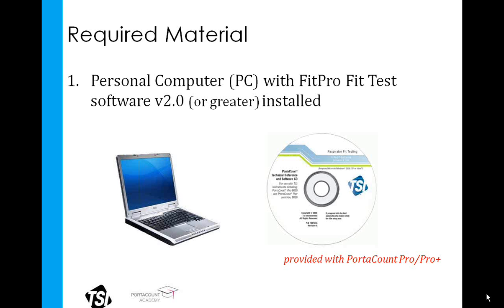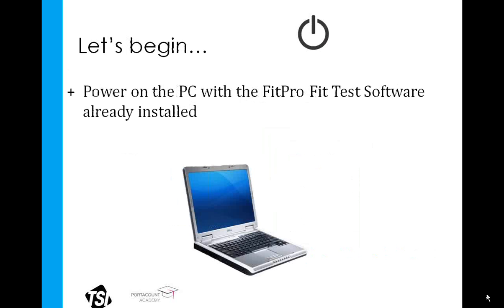Another thing to consider is that we may want to have data in our FitPro database. Some of the features that I'm going to show you here are not going to be available unless you already have fit test data in the database. So again, if you are going to be referencing another computer while you watch the webinar, go ahead, make sure that computer is turned on now and that the FitPro software is already installed.